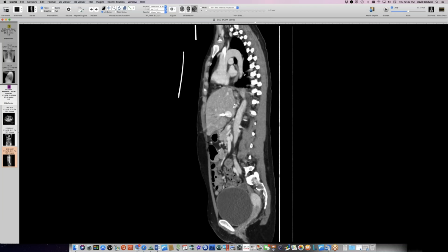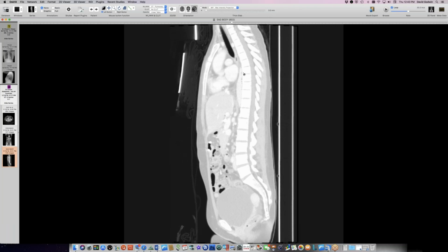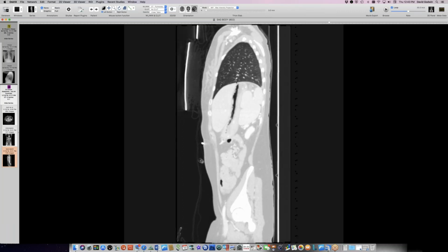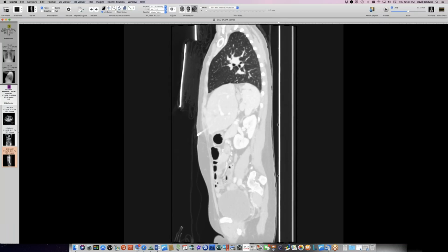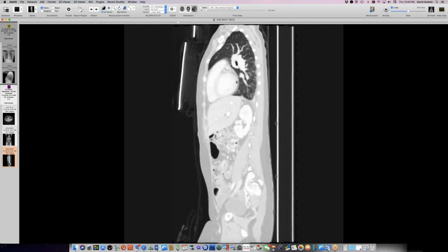And it does have some imitation of a left bronchus in terms of having a very long unbranched bronchus and not a clear upper lobe. And we should count the lobes on that side too. Let's see how many lobes are going on the right. So I think we're in the right lung here, and I'm only seeing one fissure. I'm not seeing a minor fissure. So that's left-sidedness too. Okay, so I think it's done a sloppy job of trying to be a left lung. It's not quite got there.